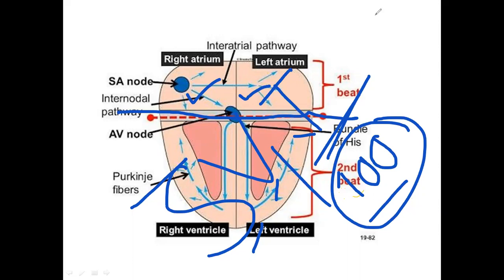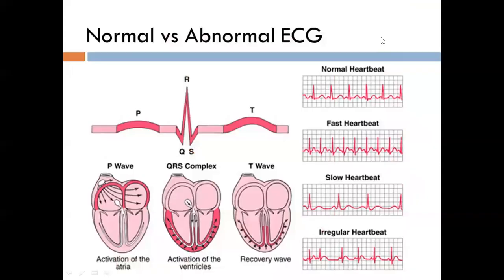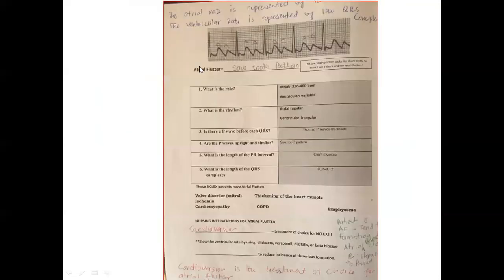It is an easy way to explain. Now let me go back again here. In this picture, showing atrial fluttering, in case of atrial flutter, what are the abnormalities or what beats can we see?